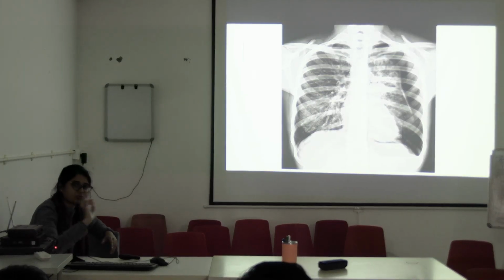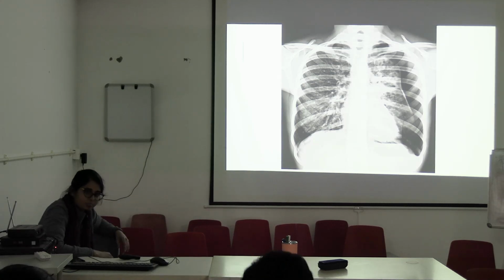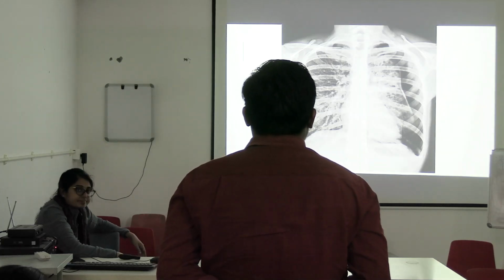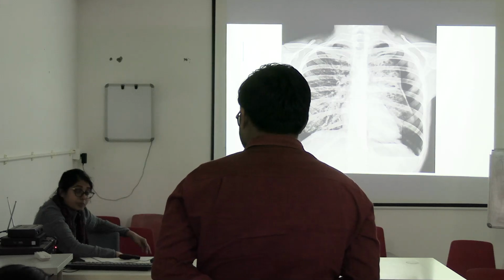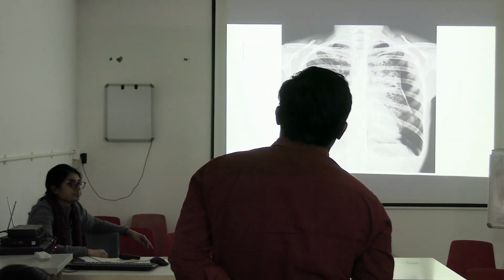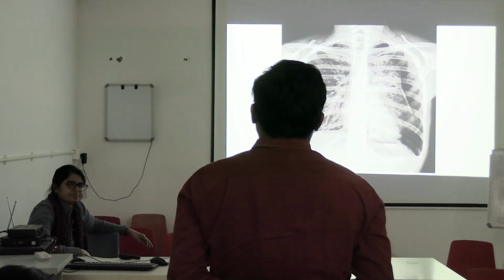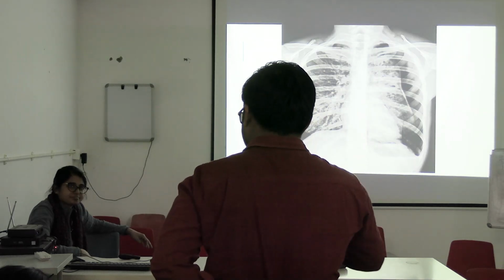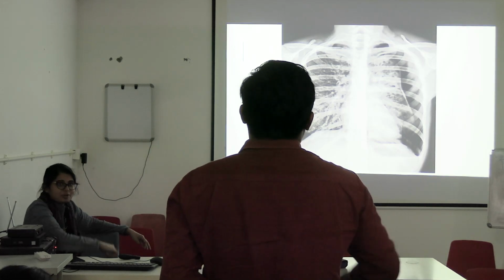এনিওয়ান, তুই বল, জাস্ট ট্রাই কেমন করে ডিসক্রাইব করবি। This is a diagram of chest of a... Okay, what is the view? The view is... it's a PA view. Okay, so view. Okay, what is the position? Position... sitting, supine. No, no, position বললাম না, midline নাকি rotation আছে বলো.